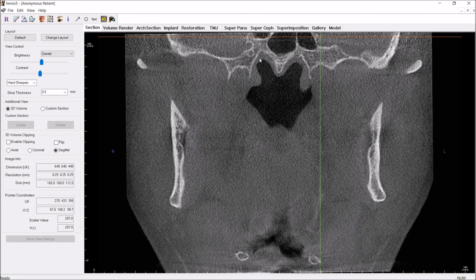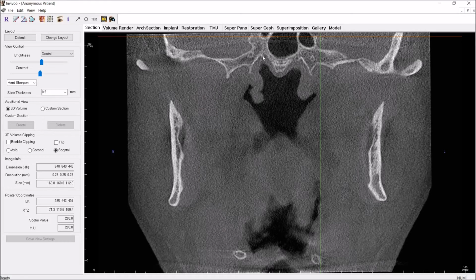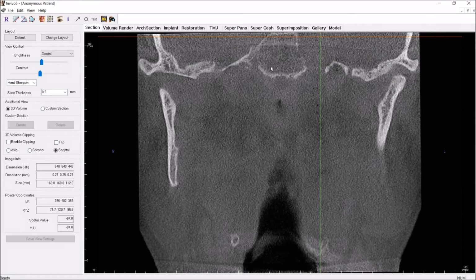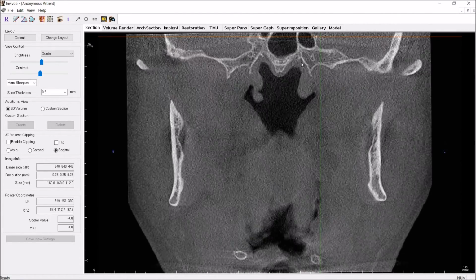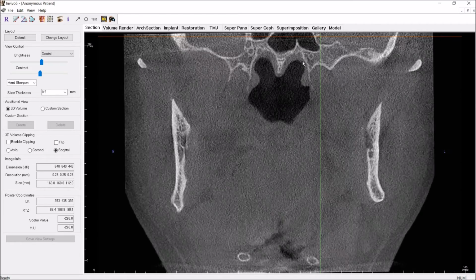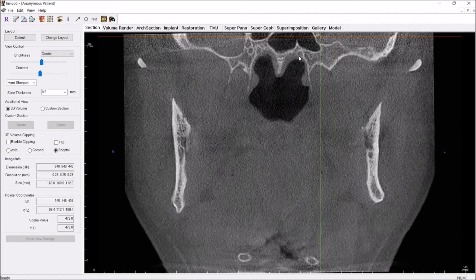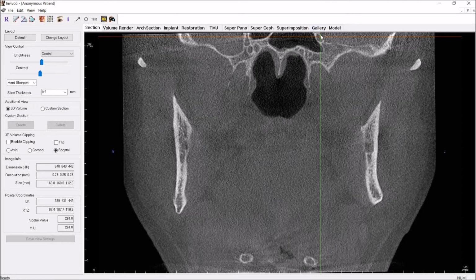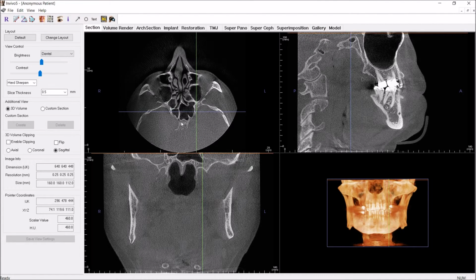Now we see these two canals more inferiorly and really traveling through the sphenoid bone into the pterygopalatine fossa. And this looks a little funny here. It looks like there's additional canals, if you noticed in the axial. Looks like it has some extra canals, and that caught my eye at first when I was reviewing this case. I've never seen it quite look like this.